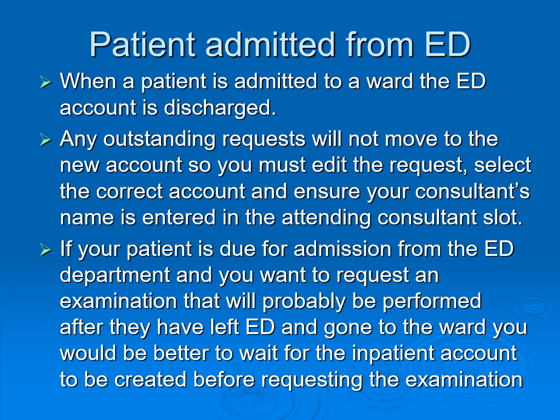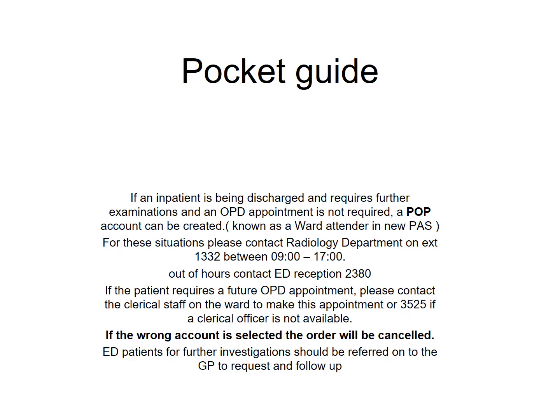If your patient is due for admission from the ED department and you want to request an examination that will probably be performed after they have left the ED and gone to the ward, you would be better to wait for the inpatient account to be created before requesting the examination. See the pocket guide for help with these discharge situations.